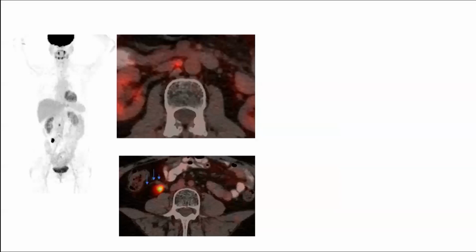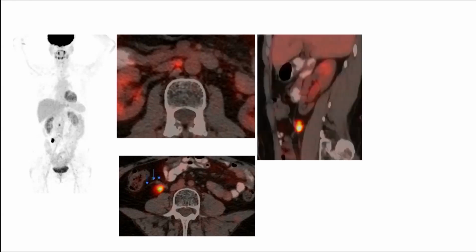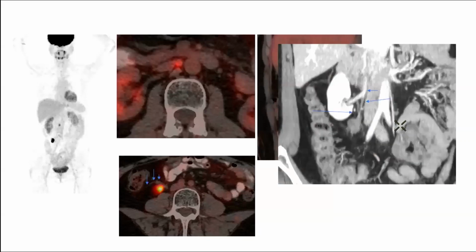So, ovarian cancer with para-aortic lymph node metastasis, which is expected, and some strange metastasis in the perirenal space. It's a very confined space. We expect malignancy there coming from the kidney, not from somewhere else. So, how did it get there? If you take a closer look, the ovarian vein here doesn't drain to the cava vein. It goes, this is the right one, to an aberrant kidney vein.